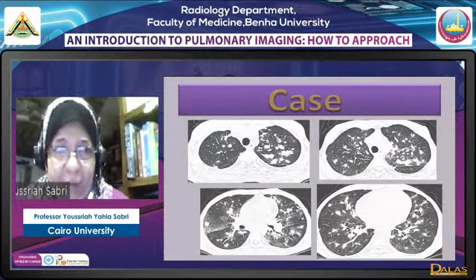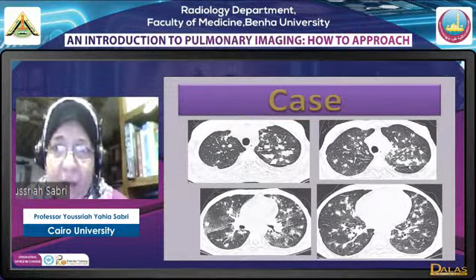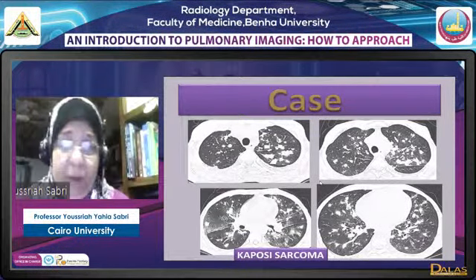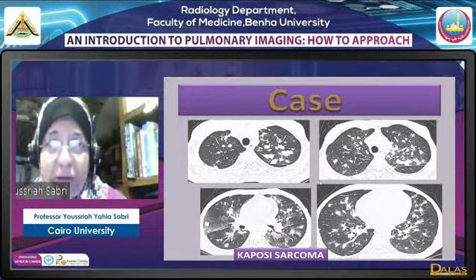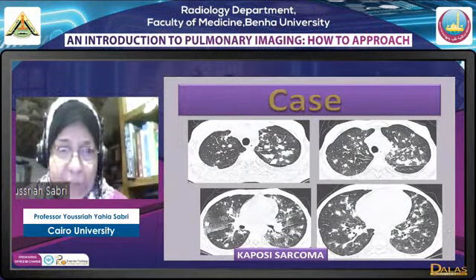In this case, we have again irregular looking nodular opacities, which are bilateral. They are flame-like opacities. Some are subpleural, related to the fissures and related to the pleura. Prominent bronchocentric interstitium is present here. Some ground glass opacification is present. This appearance actually is typical of Kaposi sarcoma. This case was sent to me from one of my students working in one of the Central African countries where Kaposi sarcoma is actually endemic.